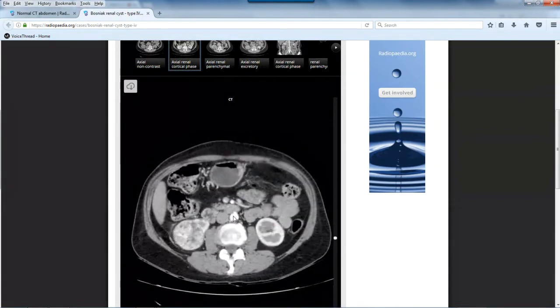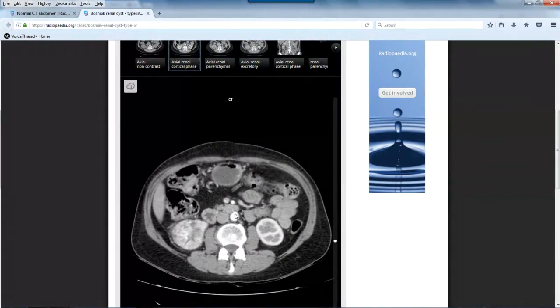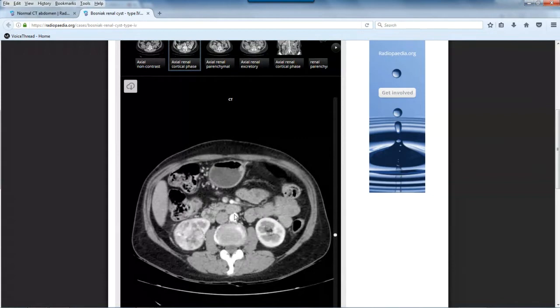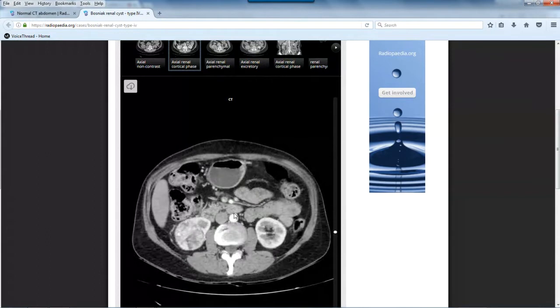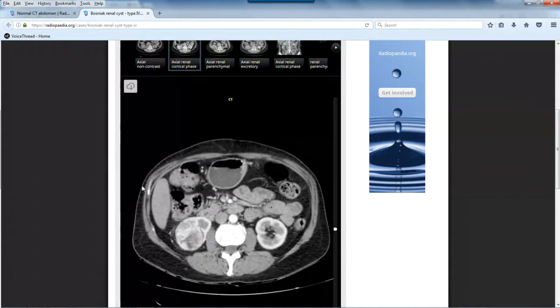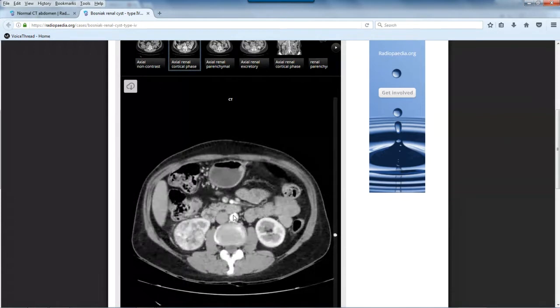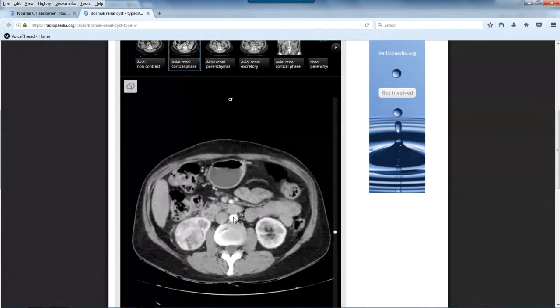The next vessel that you're going to see on this guy is hard to see because his looks like it's calcified. So if we look at the aorta and we now travel down, see this little intense bright white? That's calcification in the artery. So he looks like he has calcification of his IMA, which is very common. There's a lot of collaterals that can build in and feed blood supplies to these areas of the body, and it's not uncommon to see some calcification in the IMA. It's hard to see anyway.